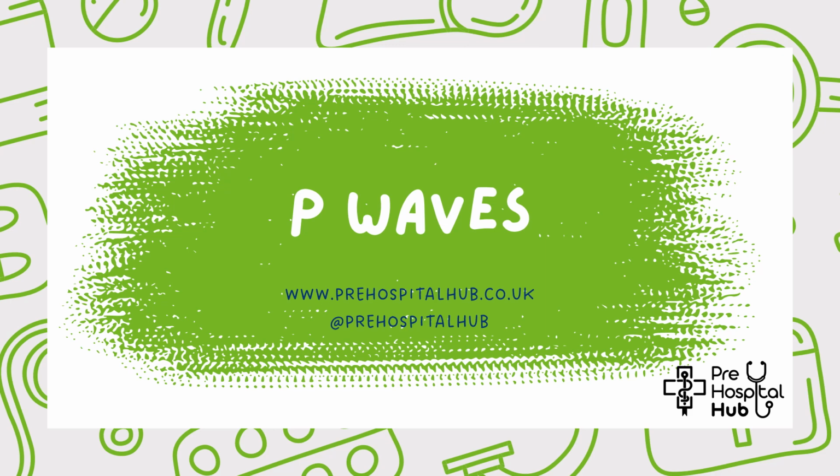Today we're going to explore P waves, including the different types of P wave morphologies that you may see on an ECG.